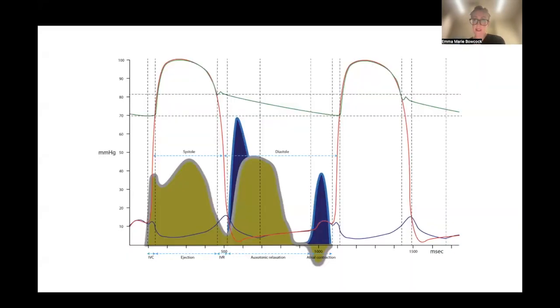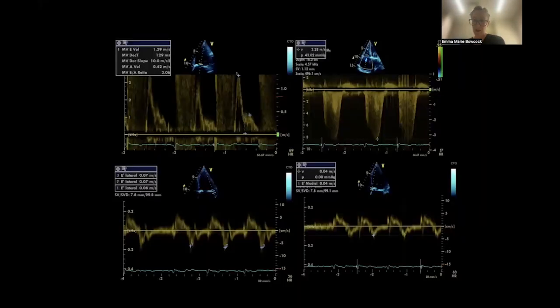But the reason I showed this case, Ben, obviously she's got moderate diastolic dysfunction, maybe severe, who knows. But the thing I wanted to highlight was how can you assess diastology with her severe MR? Because that's often one of the contraindications, right? You can't use your normal parameters in patients with severe MR or moderate to severe MR. So you have to take it all with a pinch of salt and put it together with other things. But there are some other parameters in the guidelines that you can use to assess diastology in patients with severe MR. Do you know of any of those?